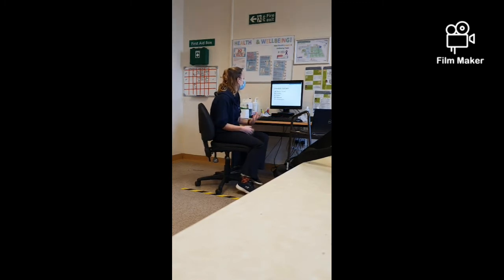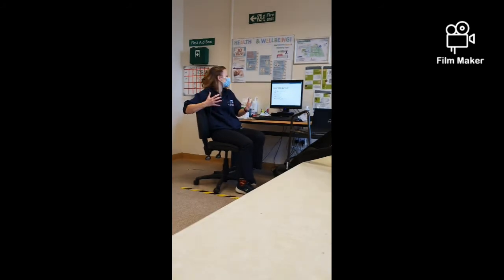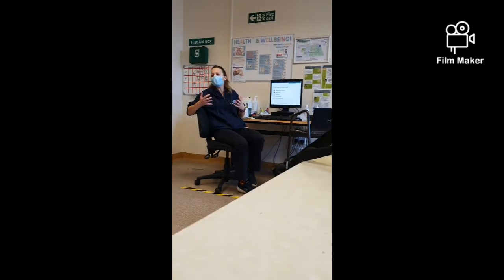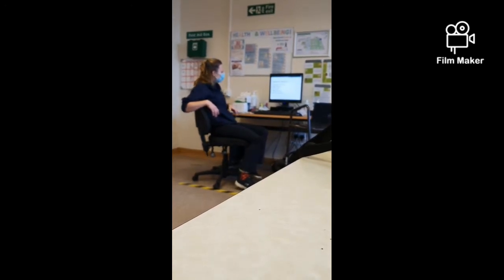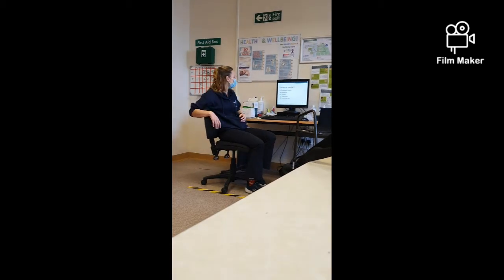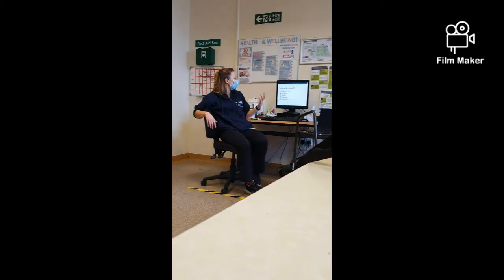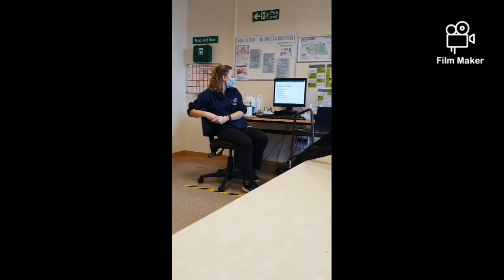Okay. And then we use a systematic approach. Every time we look at a chest X-ray, if we go through this systematic approach, it does make it easier, and we tend then not to miss things, okay? So it's A, B, C, D, E. I think everything we do at the moment seems to be an A to E approach. So you've got your A, your alignment and airway. B is your breathing. C is cardiac, so your heart. D is your diaphragm, and then E is everything else.